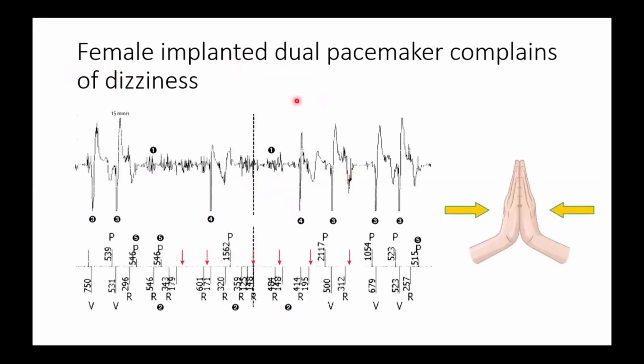Okay, this is another case. A female implanted with a dual chamber pacemaker, and she complains of dizziness. This is very common and very nice. What's seen here?